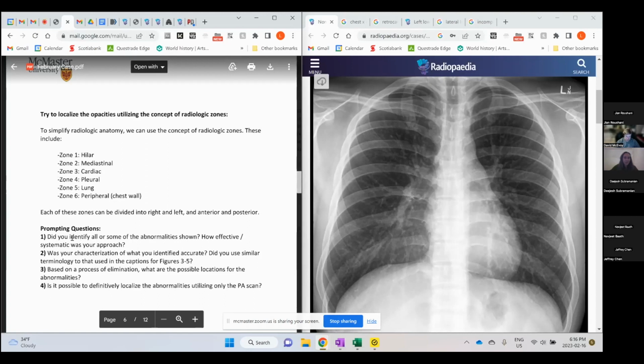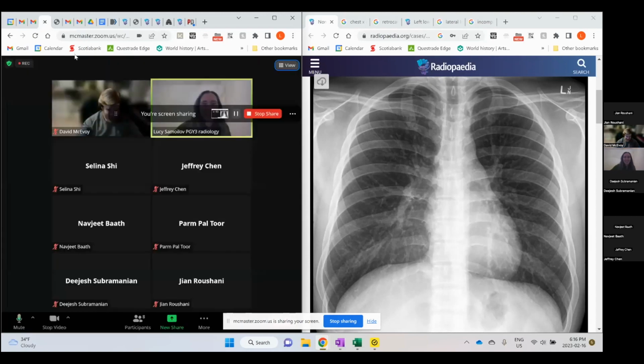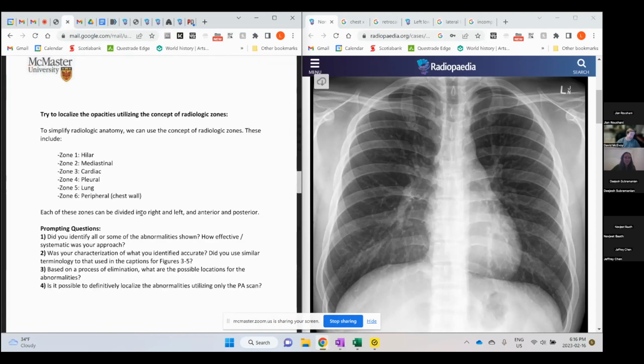Yeah, okay. Did you identify all of the abnormalities? Okay. David, how effective do you think your approach was? Yeah, I thought it was all right. I missed a few of them, even though I've looked at this case before. I always struggle with, and probably a lot of our participants do too, approaching things in a systematic way. I tend to look at the scan overall and compare it to the gestalt that I have so far of what's normal, but I struggle with having a step-by-step systematic approach to things.